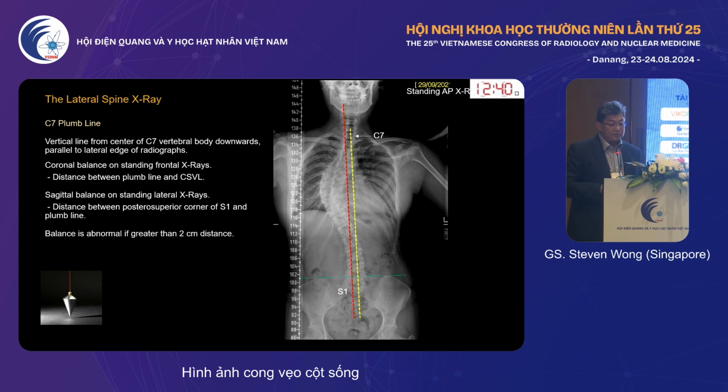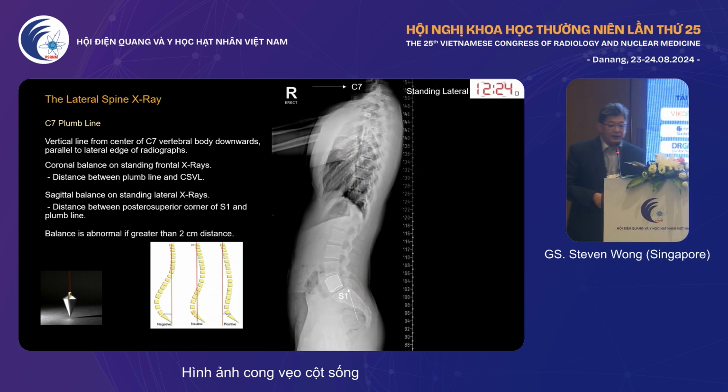It's more important when the surgeon wants to do a correction for the patient's tilt, particularly the patient in this case, have a mild pelvic tilt, right? The central vertical line may be tilted at a degree from the normal, right? The C7 plumb line is also important when assessing the stability of the spine in the lateral position.